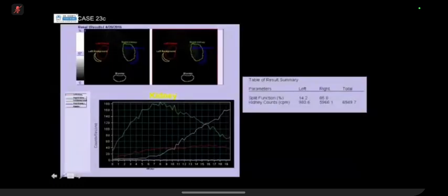But if we look at the graph, this is the right kidney, so it shows good radioisotope excretion and then good drainage. But then if you look at the left kidney, because of the reduced function, there's reduced uptake of the tracer. And then as we go to 19 minutes, as we saw in the static images, there's not really been any drainage of that kidney.